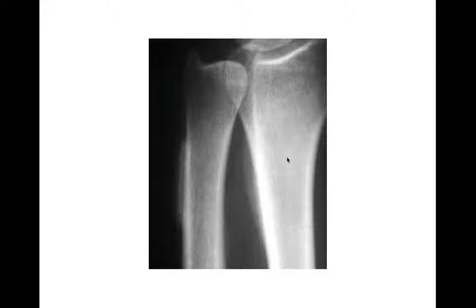All right, next is a radiograph here of the distal radius and ulna. Here we see this laminated periosteal reaction along the radius and to a lesser degree along the ulna right here. Very focal, heaped up right here, these alternating layers of sclerosis and lucency and sclerosis. This periosteal reaction in this case was due to HPOA, hypertrophic pulmonary osteoarthropathy, usually due to some underlying thoracic process. Often it could be a lung cancer, though it doesn't have to be. Any kind of thoracic process can cause this sometimes. So this was a periosteal reaction from HPOA.